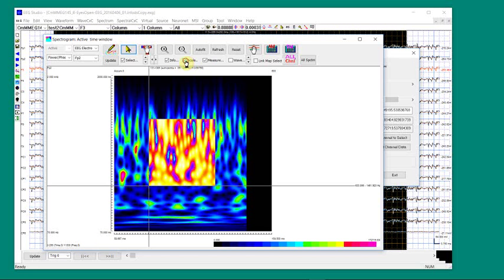At the bottom, you can uncheck this one to remove the scale bar, the color bar encoding the spectral power. You can uncheck the measure. Basically, this is gone. You don't measure it anymore. Of course, you can show the waveform. You can link it to the contour map. You can even move them. But this is basically for us to view the spectral power or real or imaginary data of the time frequency representation.